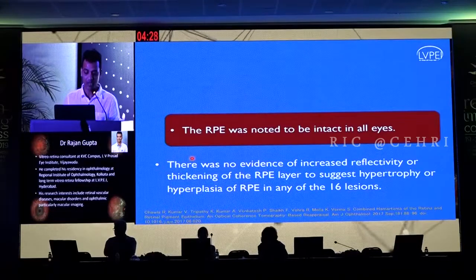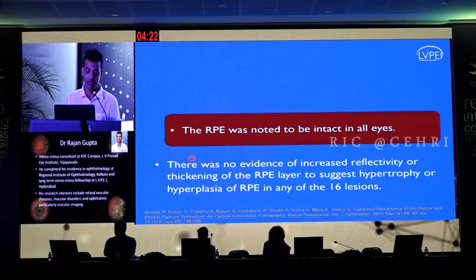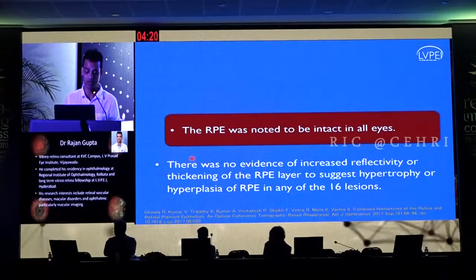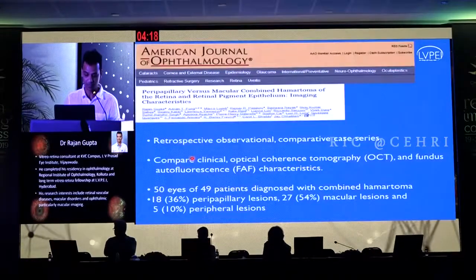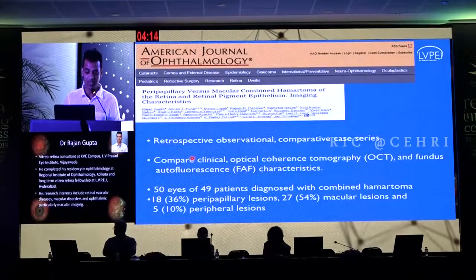So what they postulated was that since involvement of RPE was not there on the OCT, why is it being termed a macular combined hamartoma of retina and RPE? So we dug deep into this multimodal imaging and compared the peripapillary and the macular cases.